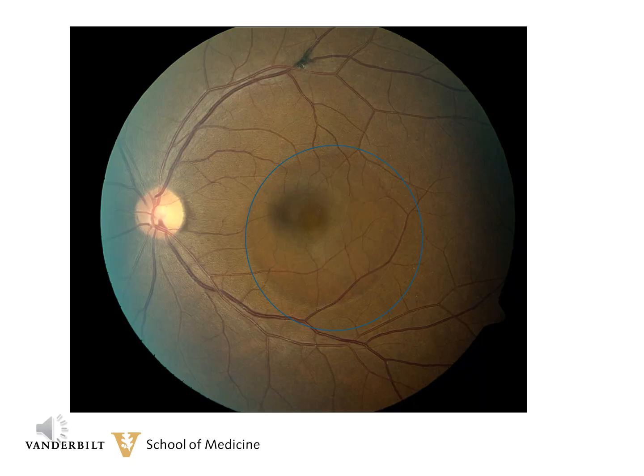Examine this clinical photograph. First, there's some hyperpigmentation along a vessel superiorly, and this is a totally incidental finding. Look at the area inside the blue circle. You can see there's definitely an abnormal foveal reflex, and the look to the RPE is just not normal as you would see in other patients.